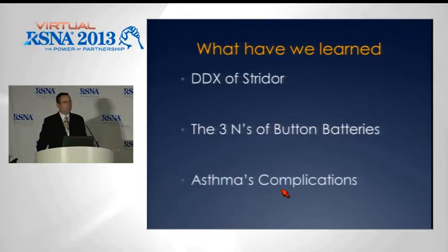And finally, asthma complications. Your gut reaction when you see the history of asthma is that this is going to be a fairly normal radiograph. You're going to look harder. You're going to make sure that you do not miss subtle pneumomediastinum or subtle subcutaneous emphysema if those two things are possible. I thank you so much for your time.